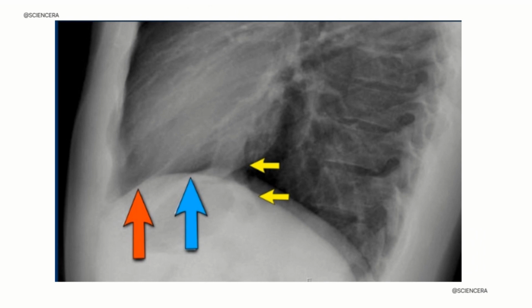In this X-ray, we are focusing on the diaphragm. When doctors look at a chest X-ray, they check for the shape of the diaphragm, which is the muscle that helps you breathe. They should see the outline of both right and left diaphragm. The right diaphragm should be visible all the way to the front of the chest. They can see where the lungs meet the organs in the abdomen. The left diaphragm can only be seen until it reaches the heart.